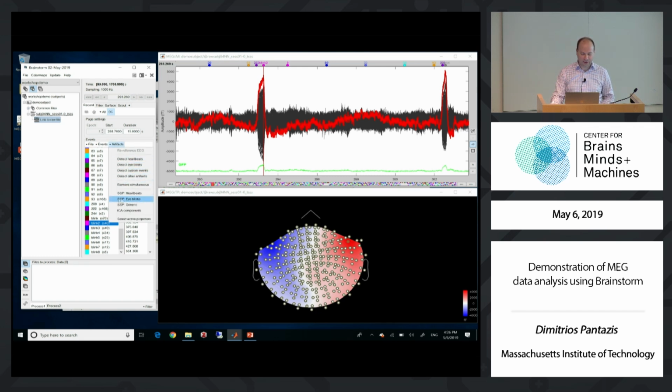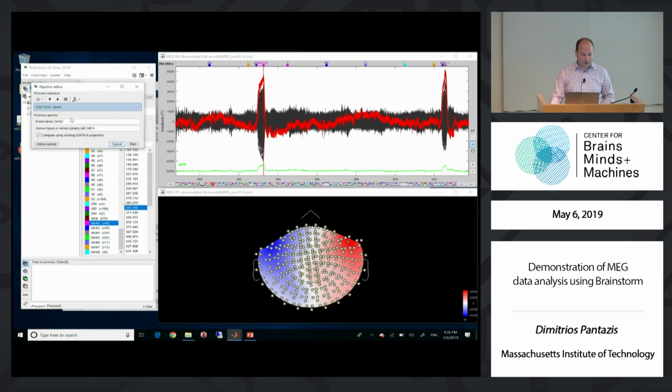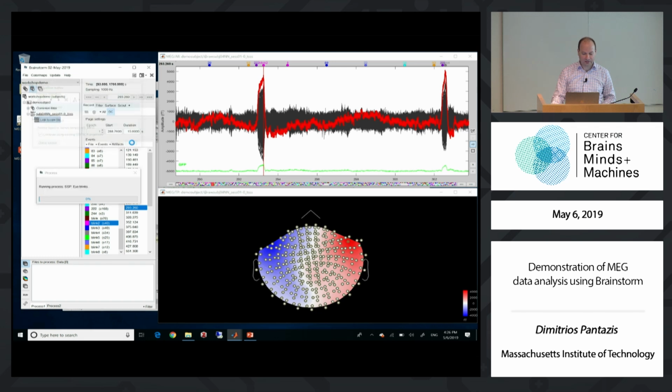This is done by using signal subspace projection for eye blinks. It already has here blink 2, which will be my event of reference to project away. And if I run this, you will soon see how these blink artifacts disappear without really affecting the remaining time series.